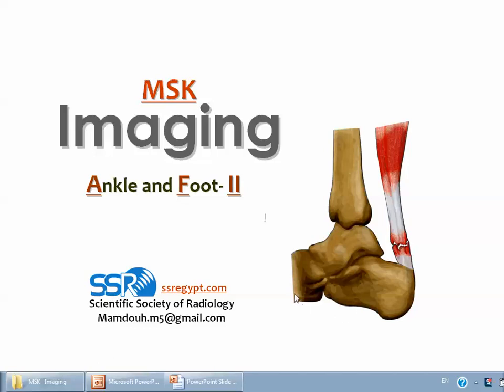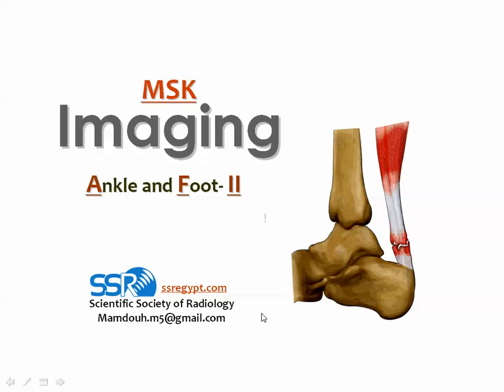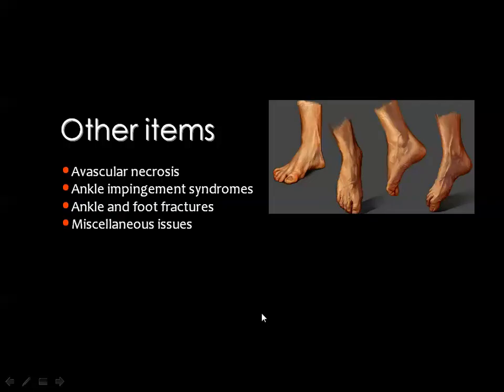Now we'll discuss the second part of the topic, dealing with imaging of the ankle and foot by MRI. We have finished with the ankle joint, and we'll start now the evaluation of the foot.